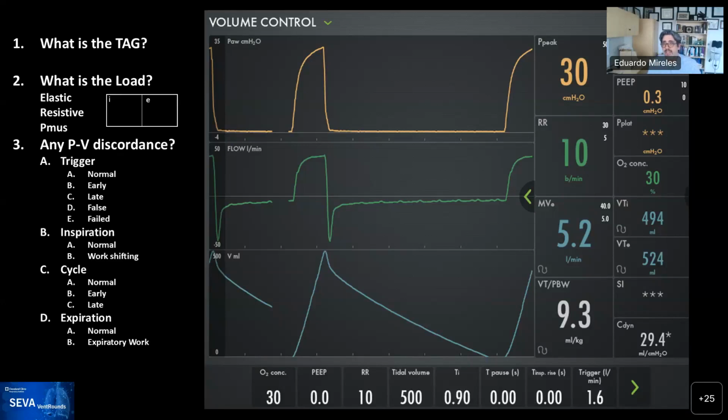As usual, I'll give you a minute to read the waveform, look at it with peace and love, and come to terms.